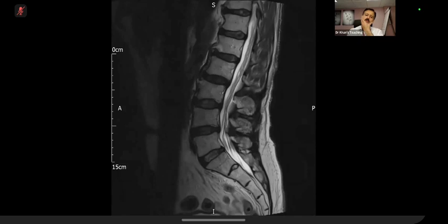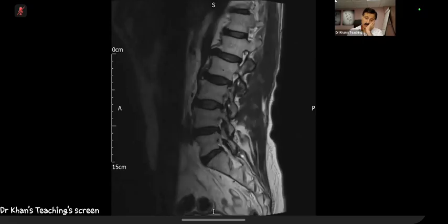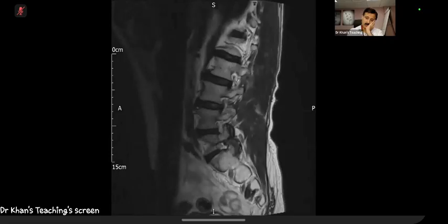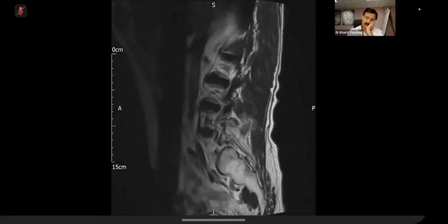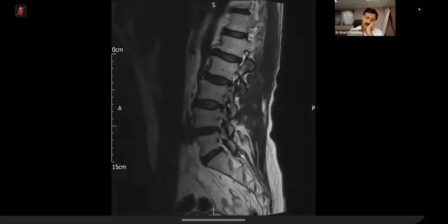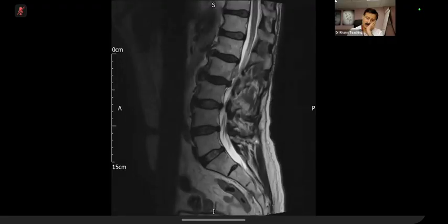You are a bit handicapped. You don't know which is left and which is right. But I might guide you. Let me see if you pick up something. Where is the left side and where is the right? I'll tell you. So this is the right side. This is the left side. You're going into the left side now. Now concentrate.